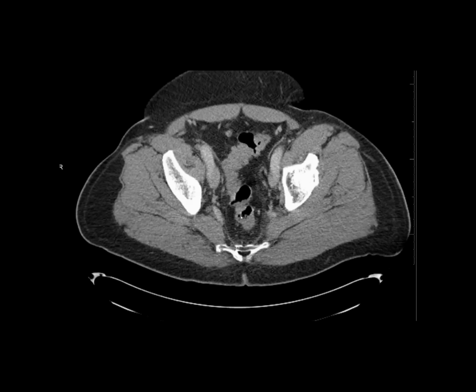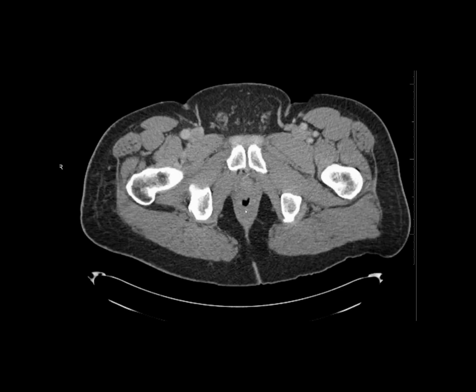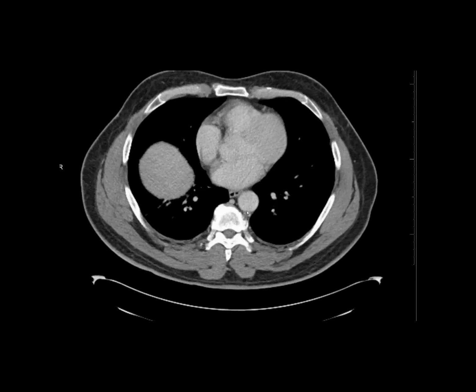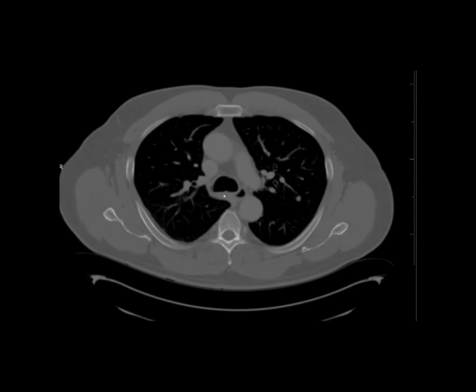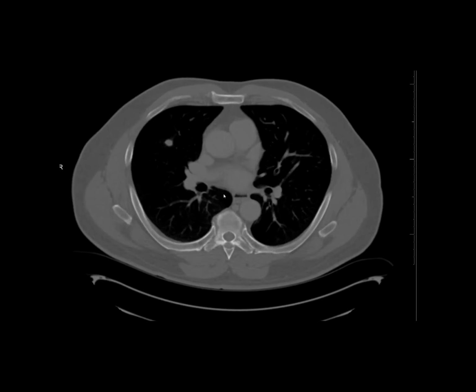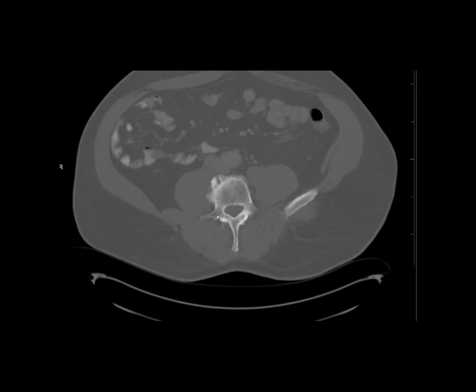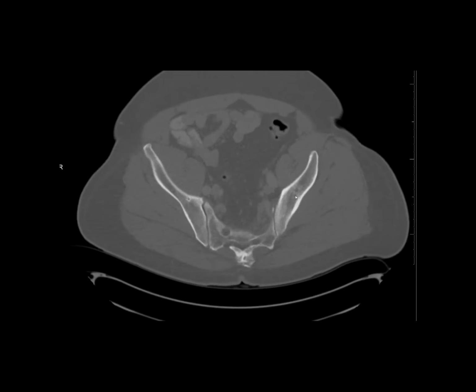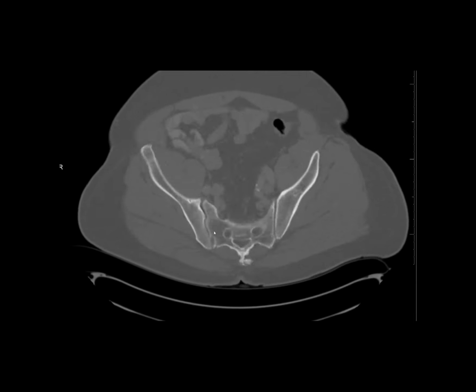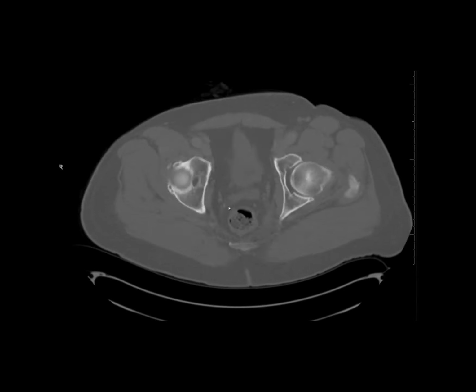Okay, so we have a patient that doesn't have any nodal disease. Now, again, if I was to think about this as a staging scan, I would want to look at the bones, because the bones are the most common site, with a high likelihood of metastatic disease. As I'm coming down here, I don't necessarily see anything abnormal. This just looks like a vascular channel, and some SI joint air.